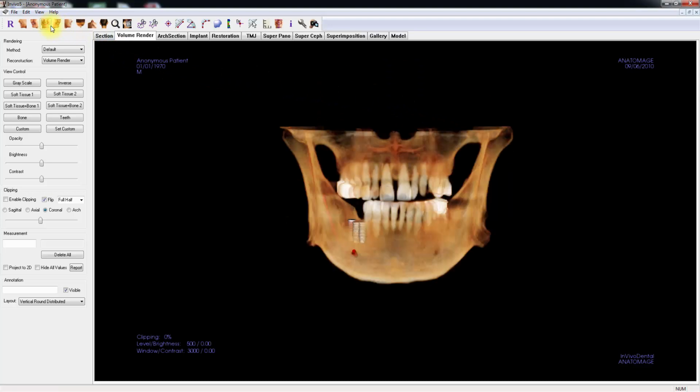These modifications will be applied to all the views with a 3D volume throughout the Invivo tabs. All sculpting can be undone by clicking Edit, Undo.